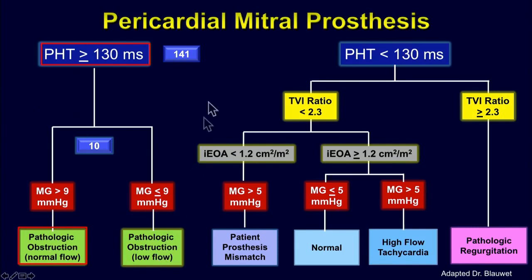Please appreciate, as you get this in your syllabus, that in the mitral prosthesis, a slightly different TVI ratio here and gradients. So subtly different, but I don't think for the exam, I think what we really need to remember is a value over about 2.2.